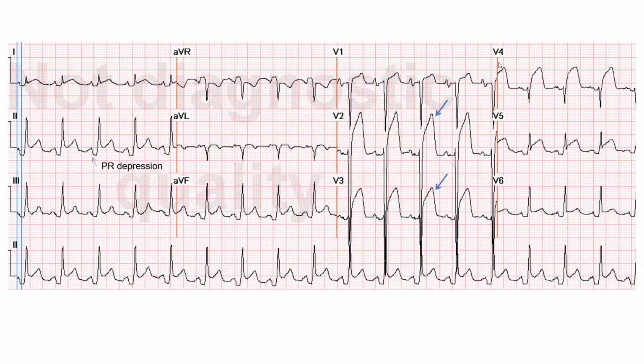And keep in mind that 30% of anteroapical MIs cause diffuse ST elevation without reciprocal ST depression, like pericarditis. This is because the apex is seen by all the EKG leads, the anterior leads, but also the inferior leads, which see the inferior apex supplied by a wraparound LAD.